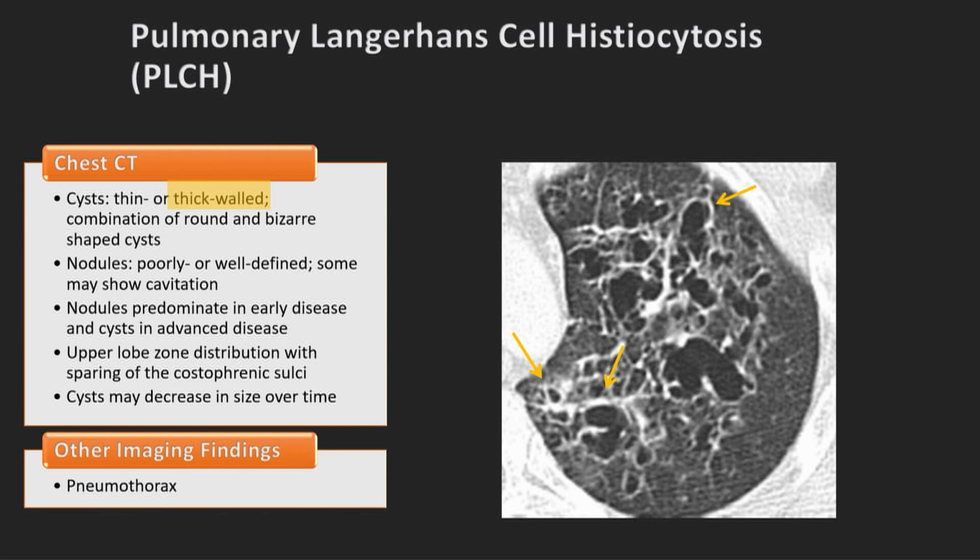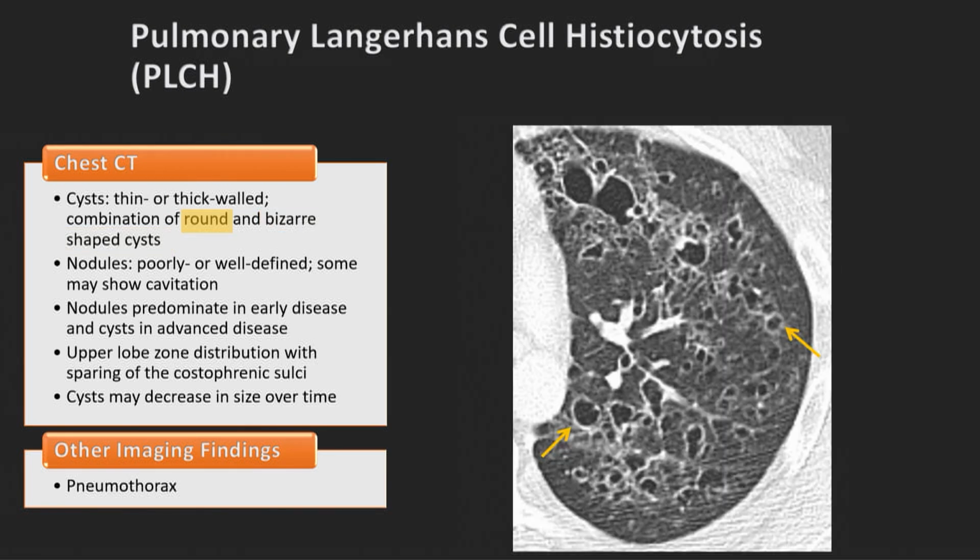You can tell that this is not your typical course of emphysema, right? Emphysema is essentially lung destruction. This has something more. These are interesting cysts. More examples here of some round cysts.